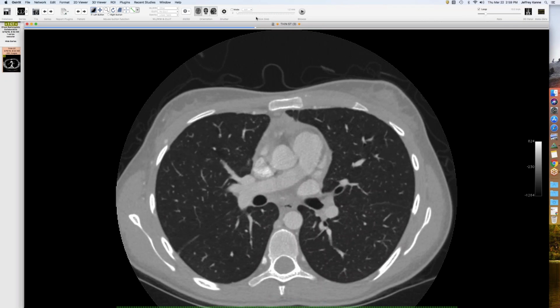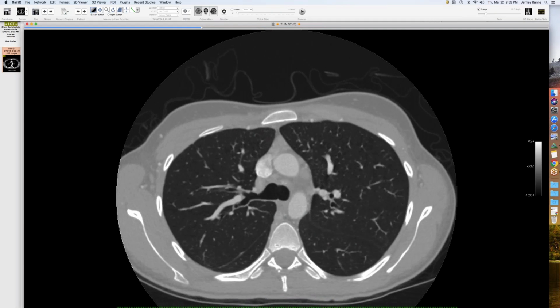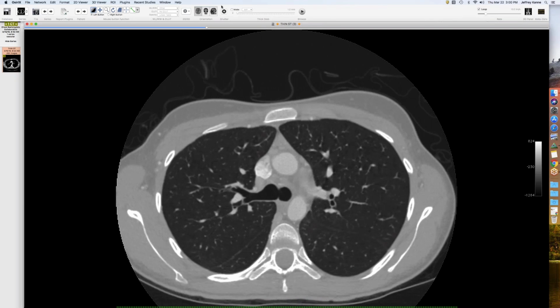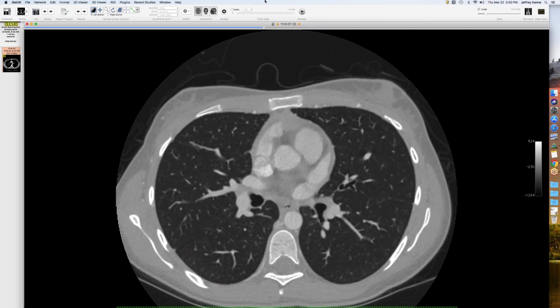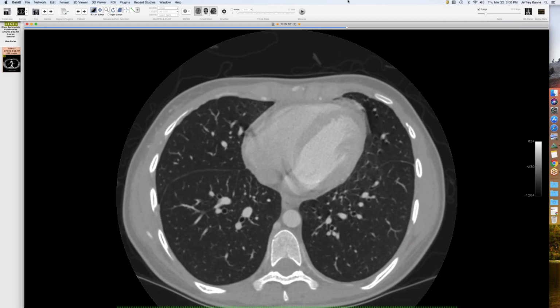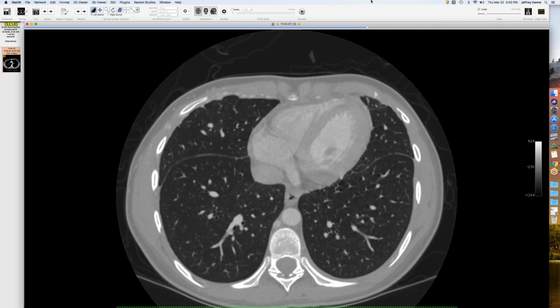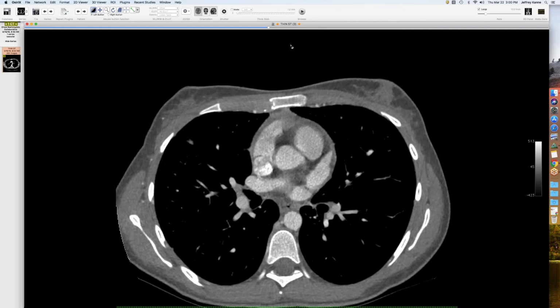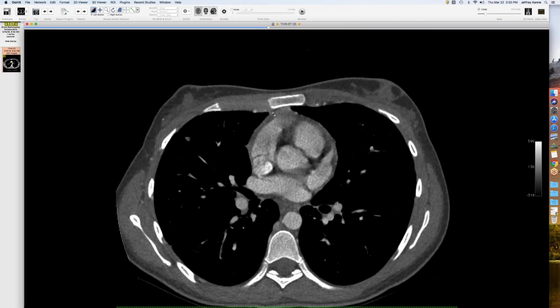It's a young woman. We didn't have a lot of history, but we know that she did have lupus, so it's possible she developed lupus pleurisy or pleuritis, I guess, at some point, or maybe flares of lupus-induced pleural inflammation, and maybe over time led to this. And it's all arterial and not venous, as far as I can tell, because we're really in an arterial phase here.